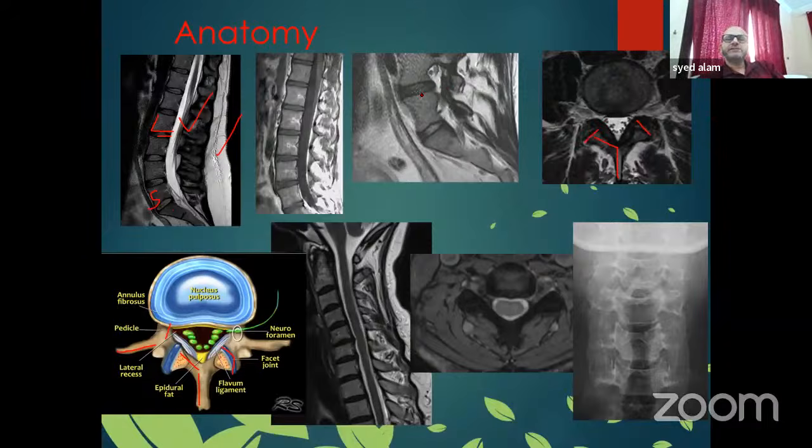And this is the parasagittal spine where we can see the neural foramen. Normal neural foramen are like a keyhole. So this is like a keyhole. So this is the exiting nerve root, this one, and there are small hair vessels.